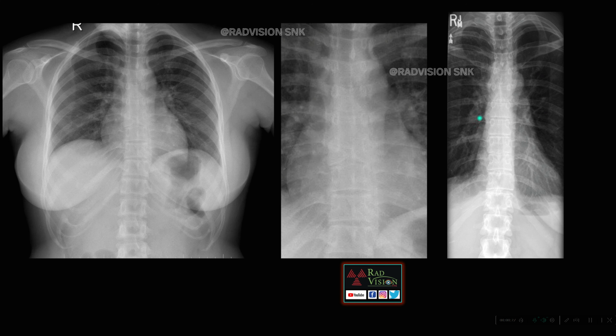And this is the other case where you can see the lung shadows appear normal, even the cardiac appears normal. However, when you see carefully the pedicles, when you observe the pedicles on both sides, on the left side at the level of T11 vertebra, the pedicle is lost. So these are the common entities we commonly miss in these areas.